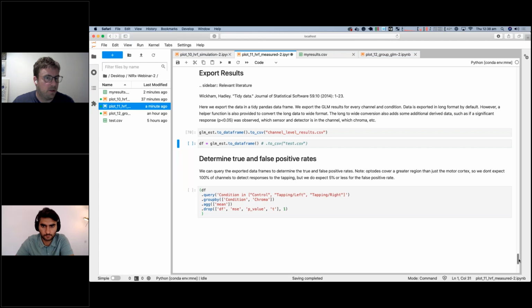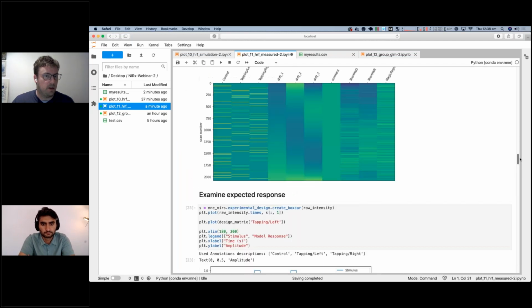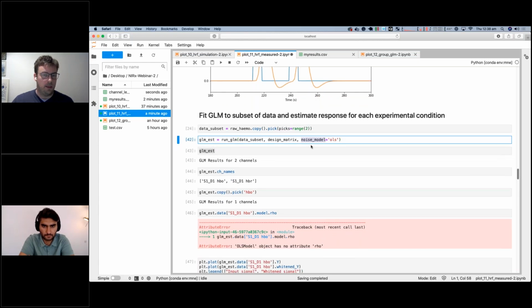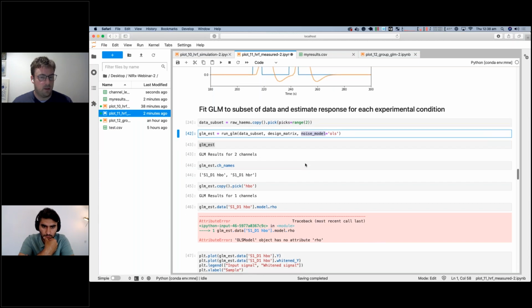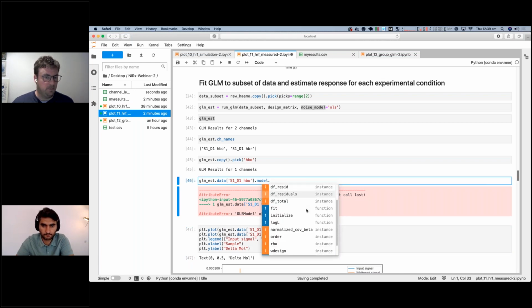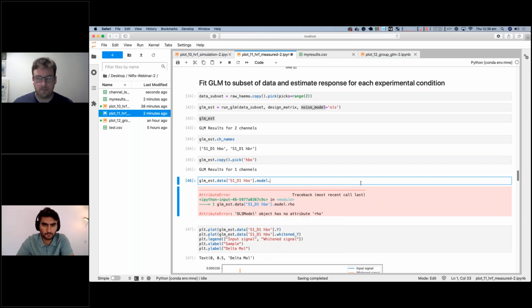Regarding the autoregressive models and the whitening, yeah, we briefly touched on that. Sorry to make everyone dizzy. So you specify that by using the noise model parameter here. And if you use an autoregressive model, then it will whiten the signal, and you have access to the whitened signal as this whitened Y. And so there's a lot more details. If you do dig in to these models, it gives you all sorts of parameters, which are probably like the log likelihoods and stuff. Which if you're into that, you can look there.